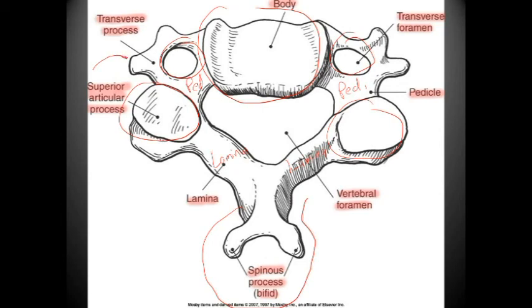And this one doesn't have a very prominent transverse process. It'd be very easy to overlook that, because you would typically think that this would be more accurate for the spinous process. But it will become easier to distinguish which is which.